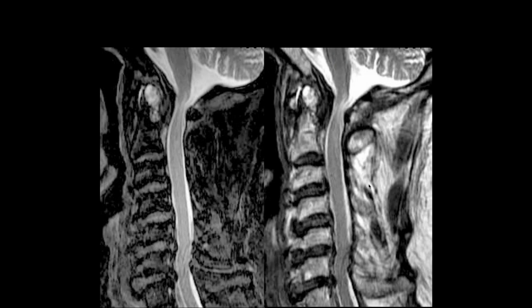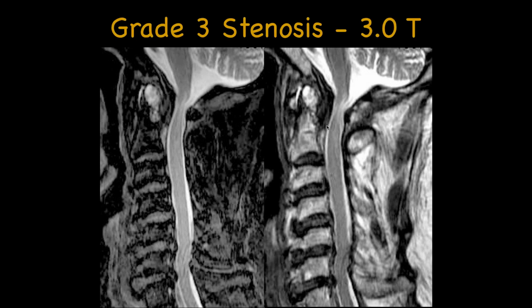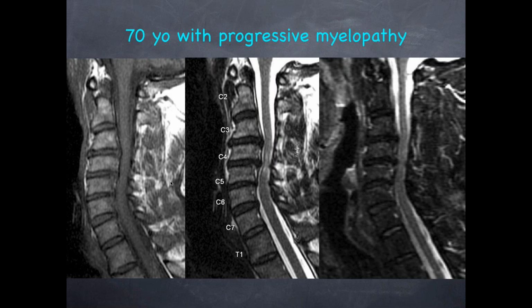Okay, so C5-C6 and C6-C7, especially C6-C7 disc protrusion. Maybe a little bit of signal there. It's hard to see. Up here, there's abnormal signal. With this grading system down here, there would be narrowing, but no abnormal signal in here. I guess it's hard to say whether there's signal there or not. Not the best study. Okay.